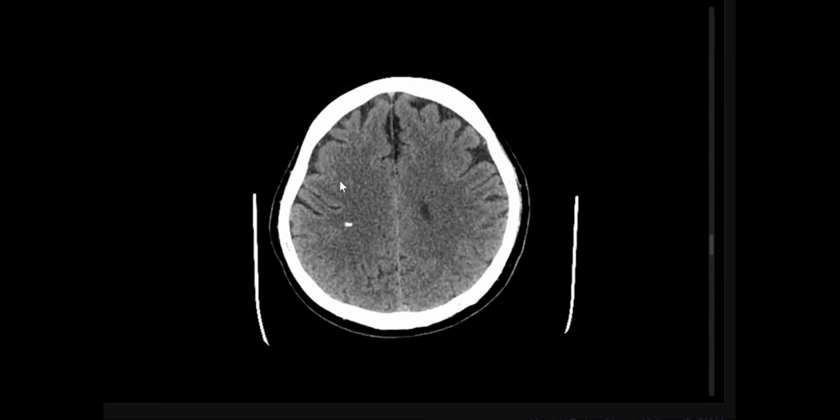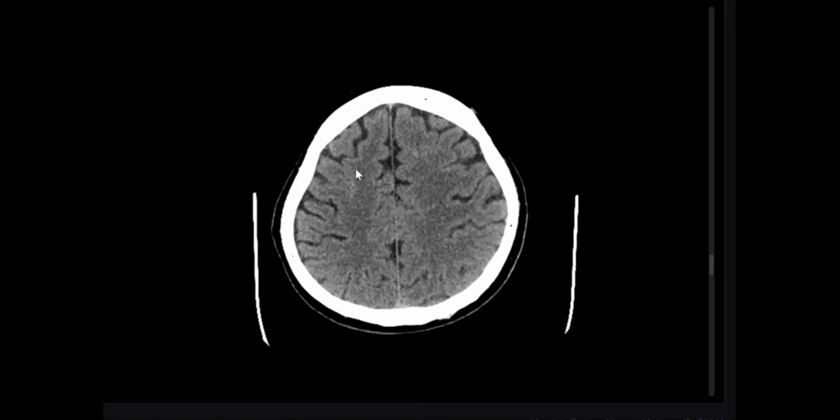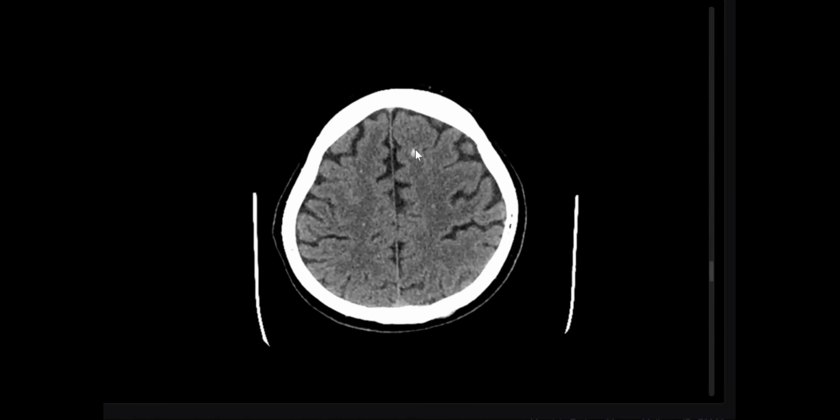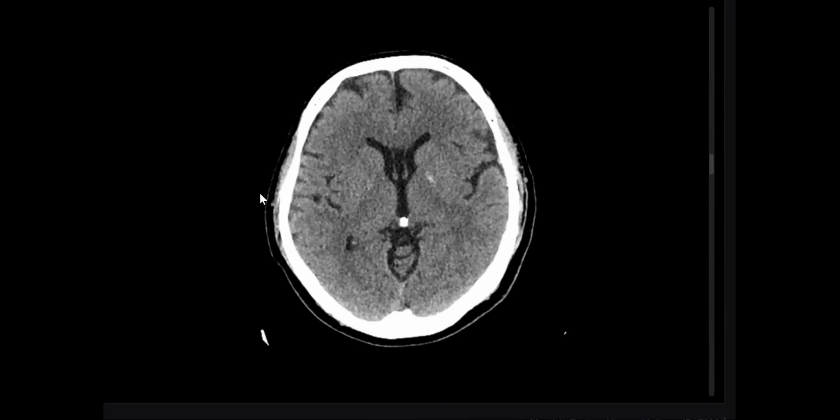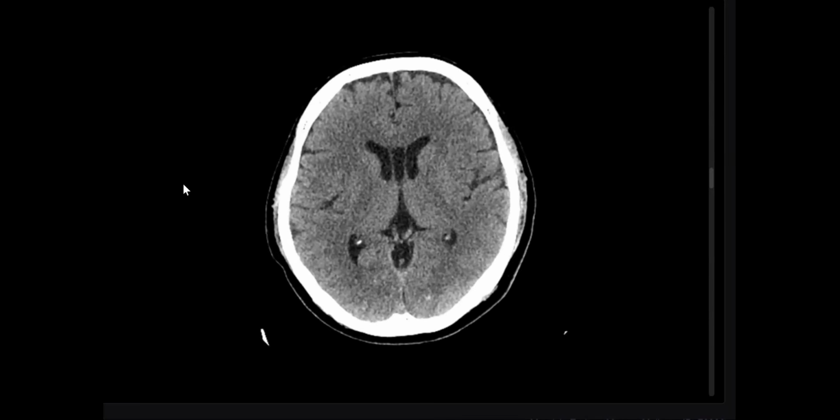When you said gray white matter, I think you will say diffuse axonal injury as a first diagnosis. So it's better to say calcified cavernomas. Gray white matter junction is highly specific for diffuse axonal injury, but there is no history of trauma. History of trauma is important, and also the patient will be in ICU in case of diffuse axonal injury. So maybe just multiple cavernomas, scattered.